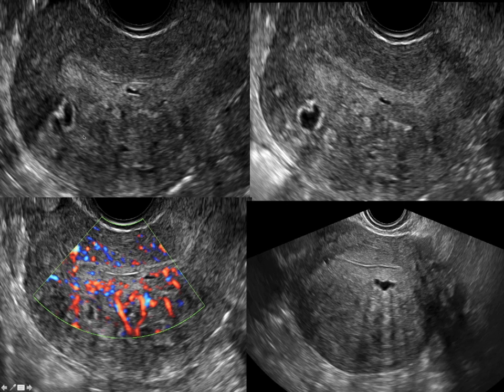Now, sometimes you can see these cysts, and they can be subendometrial, they can actually be in the myometrium, and you can see how ill-defined the endometrium is, or the junction is. The color sometimes helps to distinguish adenomyosis from fibroids. The fibroids tend to have more of a circular color pattern, but it is not necessarily that helpful in every single case.